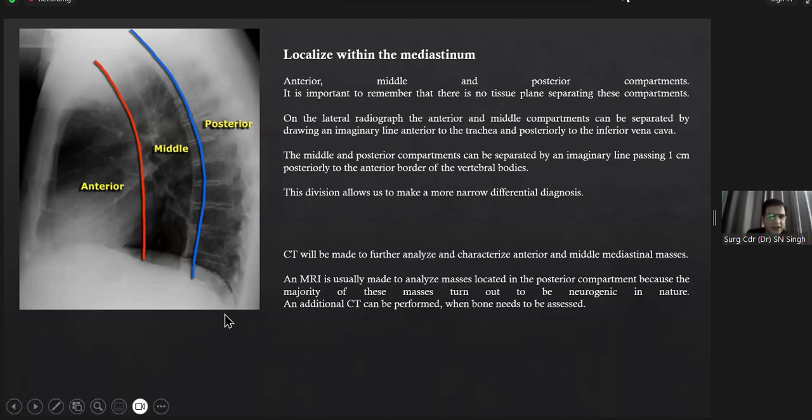Okay. So secondly, is this left or this right? So right. Very good. Because the anterior margin is clear and very sharply defined. And this is left because it is arising posterior to the cardiac shadow and it is going below. Fine. So right and left, these are two things. And then the third thing is that below the left, you see a stomach bubble. In this case, it is not visualized.